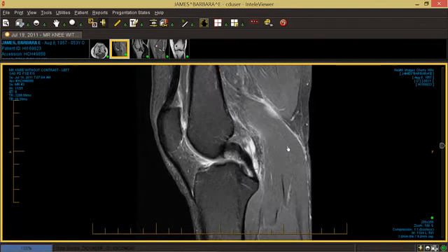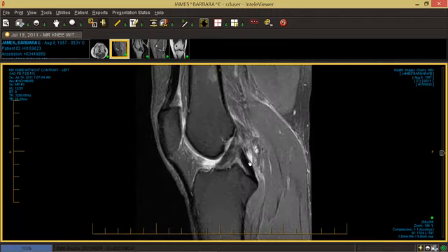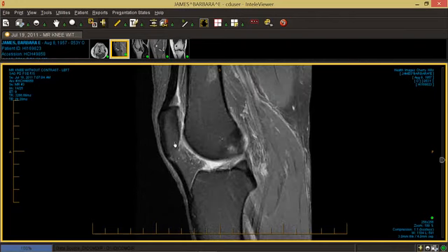And as we go through the middle, you're going to start to pick up the middle or midline ligaments. You're going to see the patella up front, or the kneecap. This is the kneecap tendon. You're going to see this is the PCL, or the posterior cruciate ligament. Next, you're going to see the ACL as we go across, or the anterior cruciate ligament, going at this 45-degree angle. And you see cartilage on the end of the bone here, this light stuff.